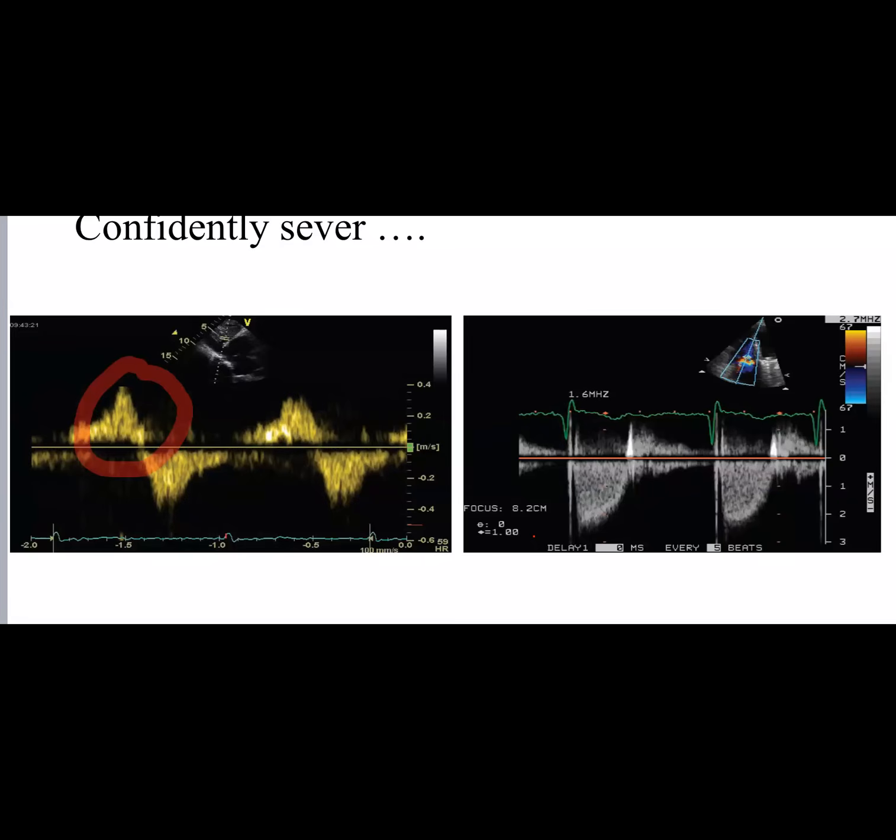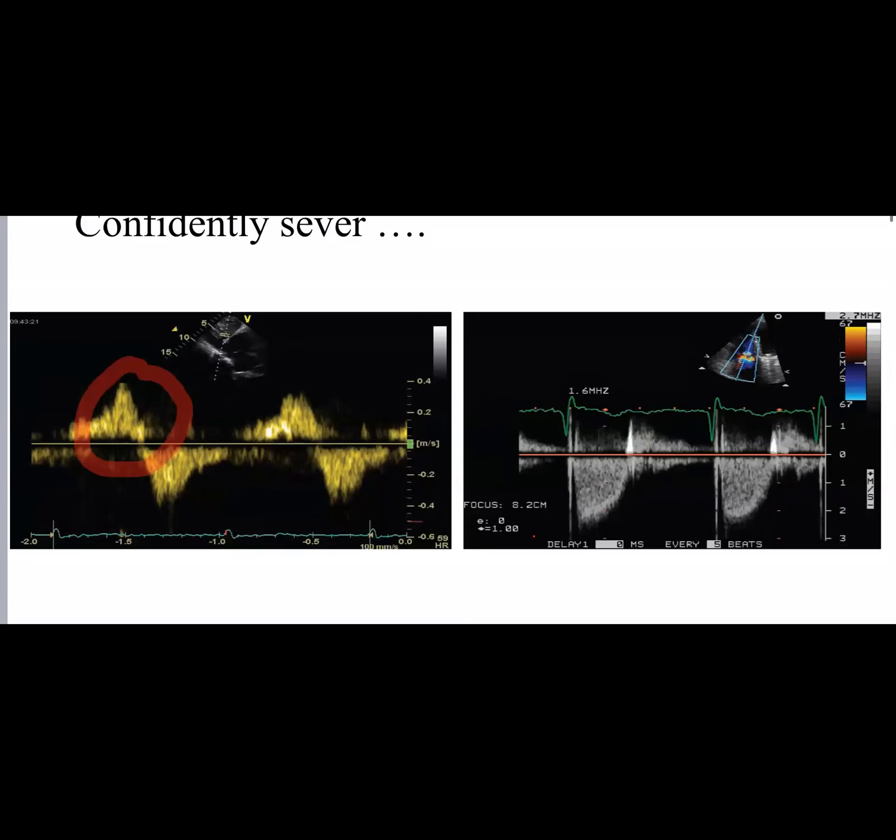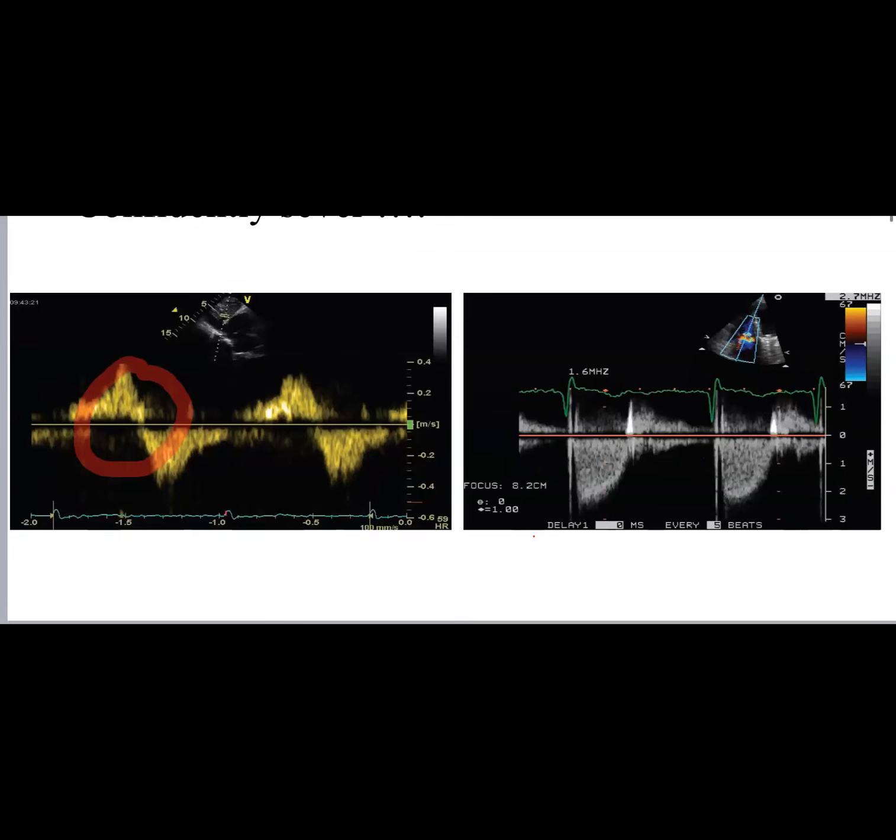Systolic reversal. And what do you think about this reversal one? Diastolic reversal happens in 3 conditions. What is this one? Is it systolic or diastolic reversal? The one I'm pointing to. This is systolic reversal, you see? It's timed with systolic. Yes, this is severe systolic TR reversal. This is severe TR, okay?